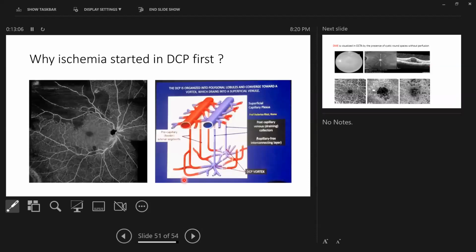So again, as I mentioned here, this is a wide field OCT angiography. This is by a Zeiss machine. It's a Plex Elite. It's a very great machine now. It's not for commercial use, it's for research. The speed of this machine is 200,000 axial scans per second.